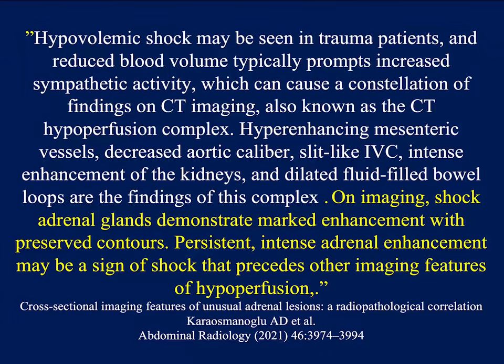Hypovolemic shock was initially described in trauma patients, but it goes beyond trauma patients. On imaging, shock adrenal glands demonstrate marked enhancement with preserved contours. Persistent, intense adrenal enhancement may be a sign of shock that precedes other imaging features of hypoperfusion. So when I see that finding, it may be an ICU patient, it may be a patient we're examining for possible abscess, it may be a patient who has all sorts of varying symptoms.